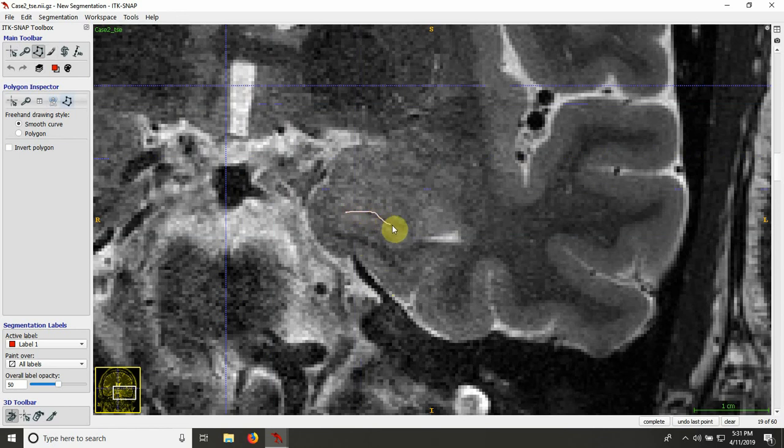So it's a little bit harder here. This image is a little bit noisier than the previous one, but I can still see this dark band surrounding the hippocampus, this dark layer, I should say. And I see the dark band in the middle. And I can also see the borders of these extra hippocampal regions. Although again, it's a little bit less sharp, but I think I see them well enough for segmentation.